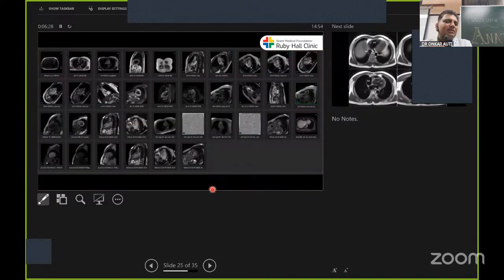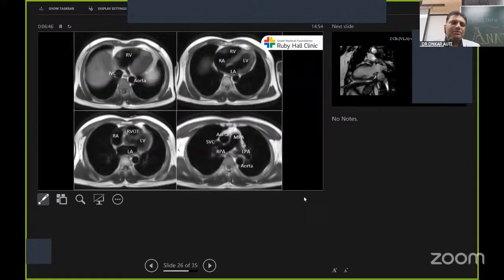Okay, so this is how a typical MR study will look like. There are so many sequences. In CT, you just saw that one plain phase and one iodinated contrast phase. That's it. But here there are too many sequences. Maybe the images are less in number, but too many sequences to handle. Not going into much detail. So, just as we saw the anatomy of the heart at various axial planes, similarly, we can see on MR.